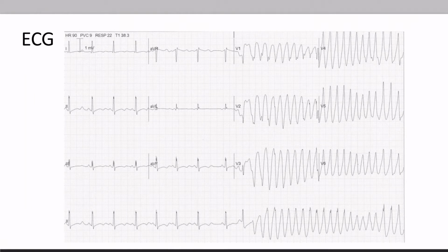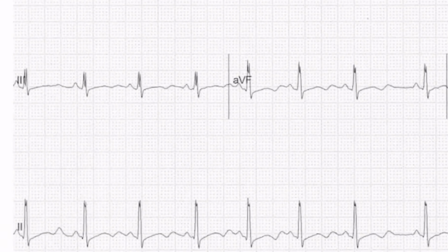However, we're still going to actually go through each of the steps. Many of you guys probably know what this is just by looking at it, but it is still helpful to remind yourself of each of these individual components. So we'll go to the rate first.